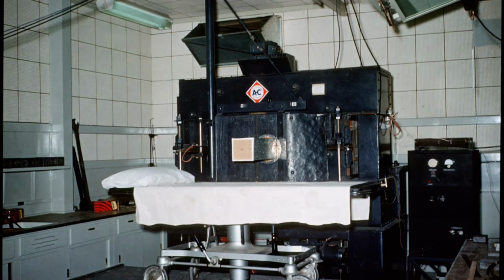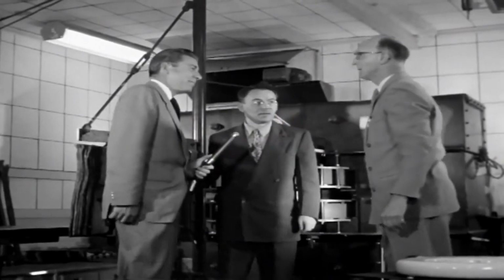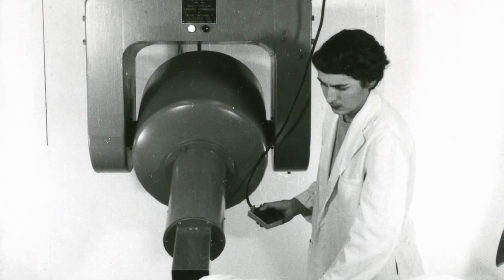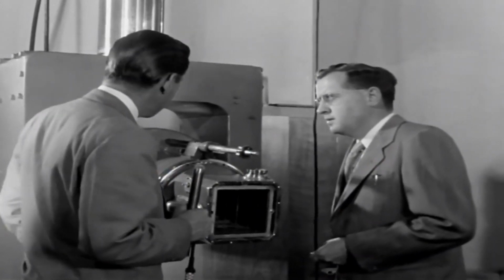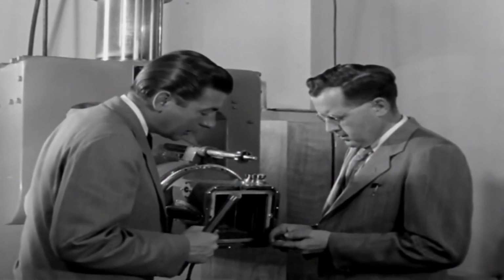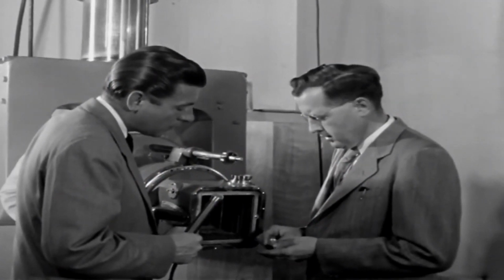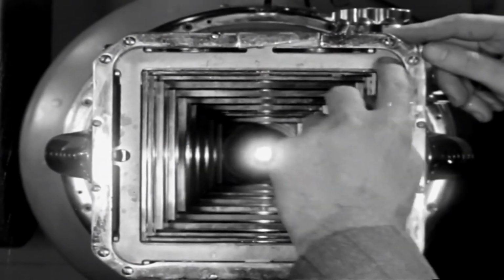Two Cobalt-60 apparatuses were then built, one in Saskatoon in the cancer wing of the University of Saskatchewan and the other in London, Ontario. Dr. Johns collected depth dose data at the University of Saskatchewan, which would later become the world standard. The first person to be treated with Cobalt-60 radiation was treated on October 27, 1951, at the War Memorial Children's Hospital in London, Ontario. In 1961, cobalt therapy was expected to replace X-ray radiotherapy. In 1966, Walt Disney's lung cancer was treated with this procedure, but it could not prevent his death.